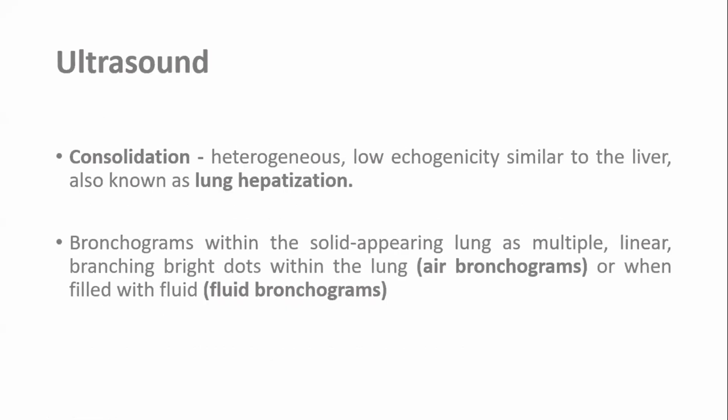There are two things that people always ask: what is this lung hepatization? It's when the lung is consolidated, it looks like the liver. And you may see air bronchograms, or if the bronchi are filled with fluid, fluid bronchograms on ultrasound also.